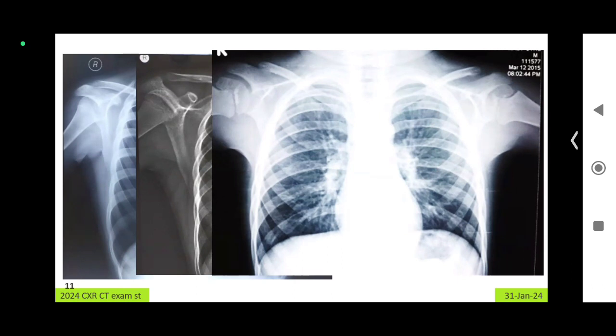But what you are seeing is only the bronchovascular marking, because if you look at all the bronchovascular markings, always it has to divide into two, because any artery branches into two. Any bronchus divides into two. So it is going to be the bronchovascular marking that you are seeing and not bronchopneumonia. If it is an underpenetrated film, you will mistake it for a pneumonia.